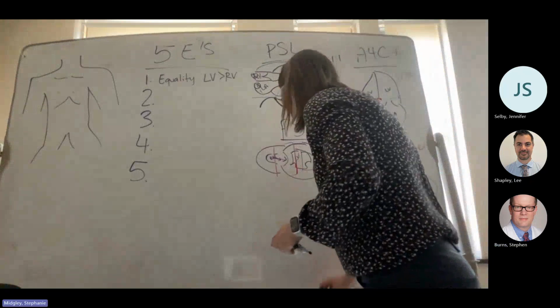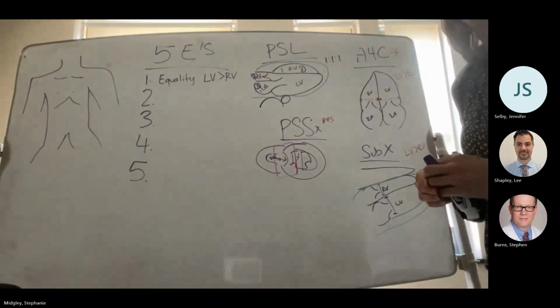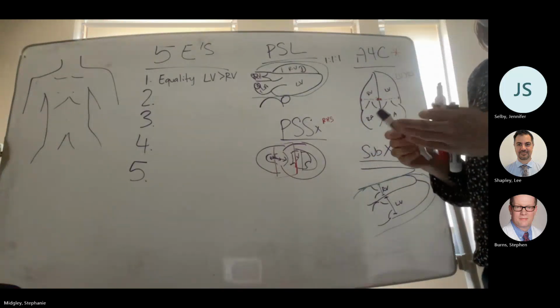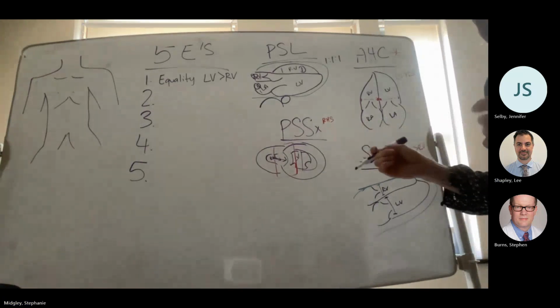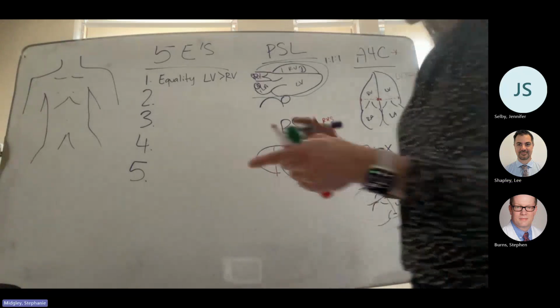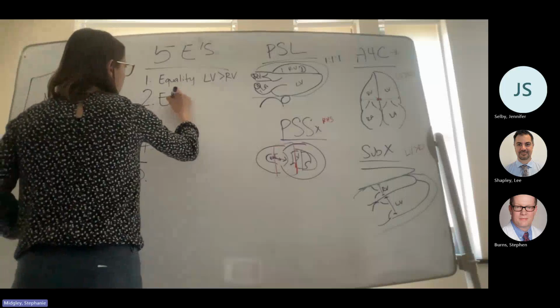All right, so we got equality. What else do you guys think there is? Effusion. Effusion, perfect. All right, so we got equality, and the next one's effusion.